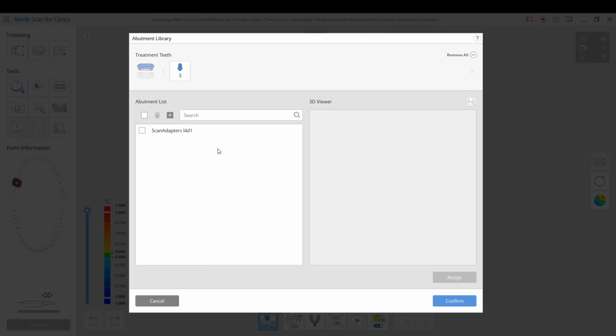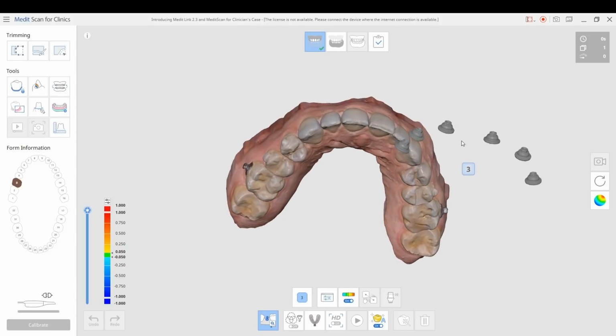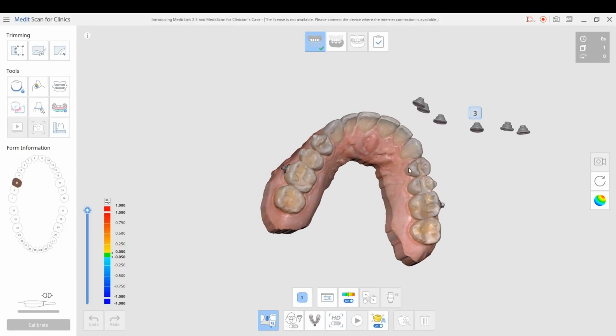but it's another way to incorporate other STLs. Here I just have a simple 6-unit multi-unit abutment model from a photogrammetry program that we've brought in that you would click on, and now when you scan, you can try and merge these things live.